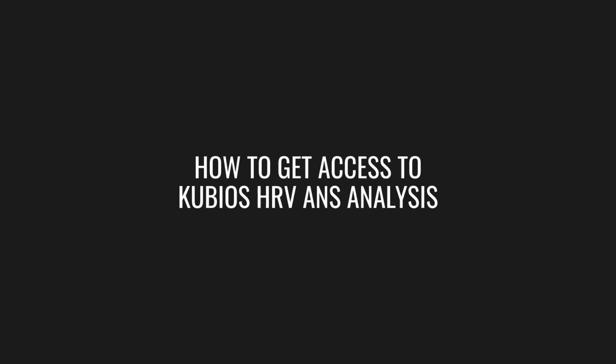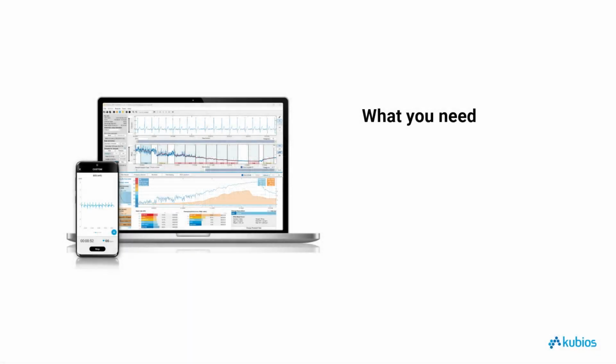Before diving into the analysis, let's talk about how to get access to the ANS function analysis within Kubios HRV software. To access the features of autonomic nervous system analysis, a license for the full scientific version of the software is required. Licenses can be obtained directly from our website.